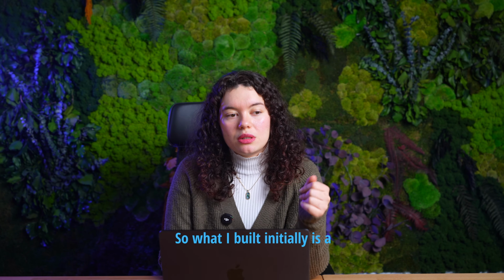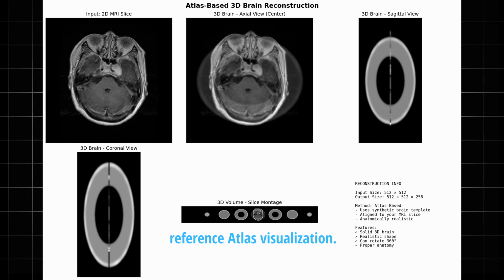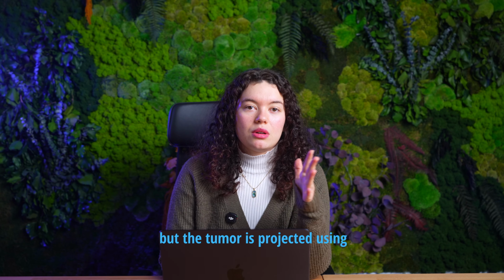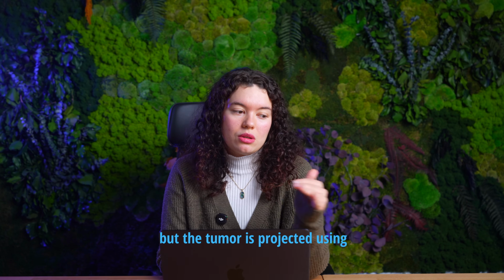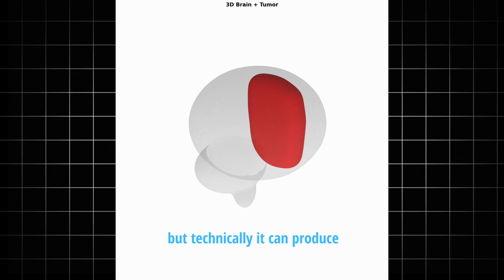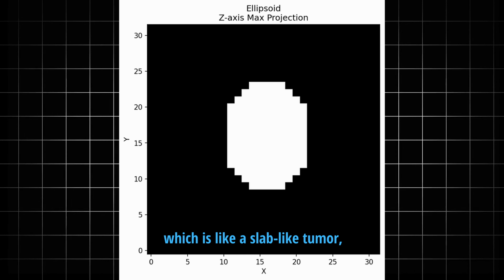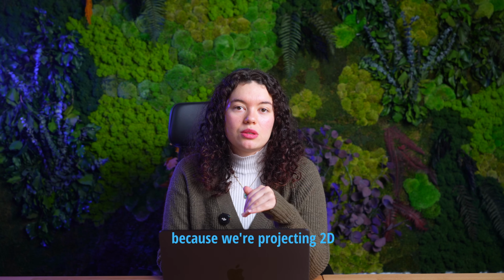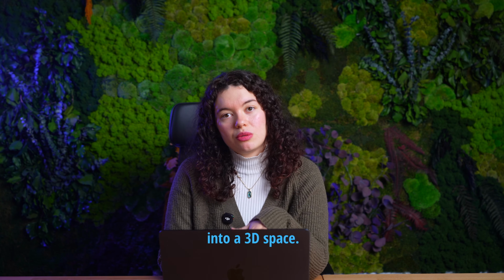So what I built initially is a reference atlas visualization. The brain shape comes from a standard atlas, but the tumor is projected using the GradCam mask, and visually it looks impressive, but technically it can produce artifacts, like a slab-like tumor, streaks, and branching, because we're projecting 2D information into a 3D space.